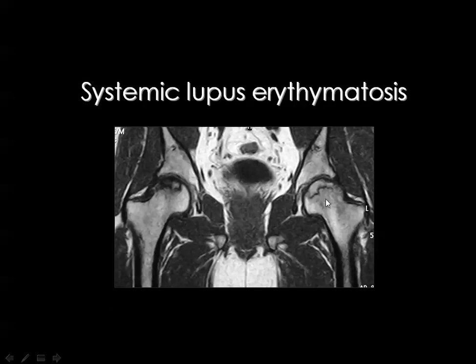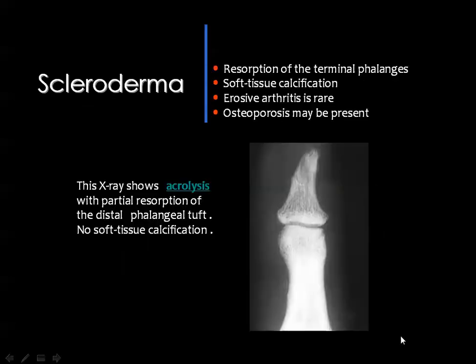If you see that the dead bone is of similar signal intensity to the normal bone, then this means that this is an early stage of avascular necrosis. But if this dead bone has transformed into fluid signal, you are dealing with a more advanced disease. And if it is in the form of bone sclerosis, you've got the severest type of the disease.